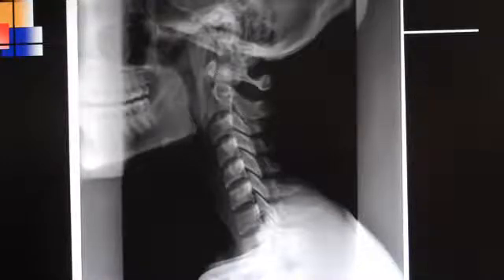Now this little dark space that is right behind the anterior tubercle, right in this area right here to the front of the odontoid process, is called the ADI, and ADI stands for the atlantodental interspace. Then of course you see the odontoid process is this, and it goes all the way up to right here, so that will be superimposing a little bit of the occipital condyles right there. And so we see the odontoid process is all of this. So it's going again up to this point right here and down to this point right here.